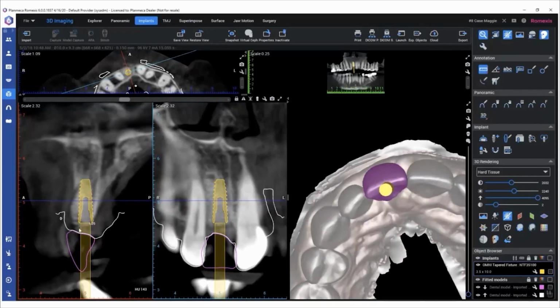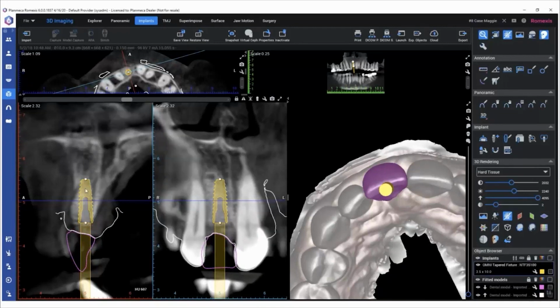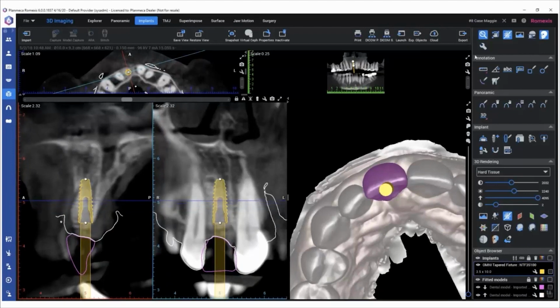One rookie mistake that I find that our residents do all the time is there's this tendency to place the implant platform at the crest of the bone. But in this case, we're 2 millimeters away from where the future gingival margin is going to be. Absolutely not adequate in the anterior. We need to go ahead and drop that implant a little bit, right? And we can remeasure it to make sure that we're happy about the depth. So slightly subcrestal.